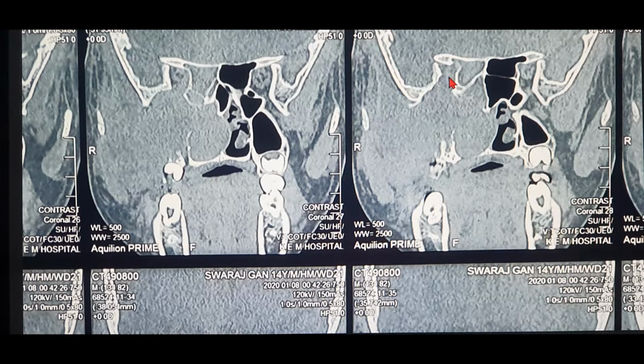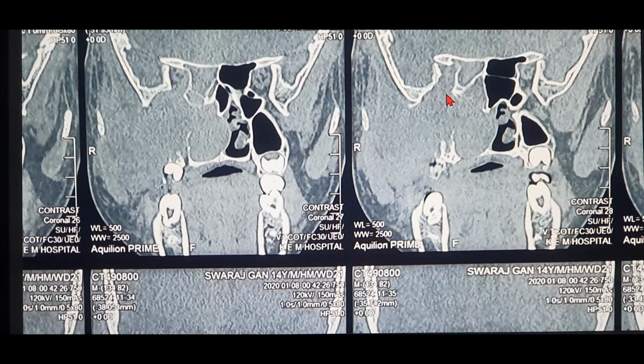Now guys, if you take a coronal section, which this is, this level is at the level of the orbital apex and the inferior orbital fissure. As we all know, the cavernous sinus will not appear at this level because it is still more posterior. The inferior orbital fissure enters the orbit from an inferior aspect.